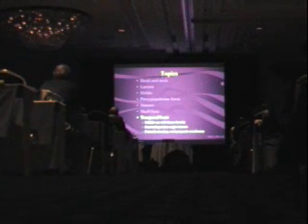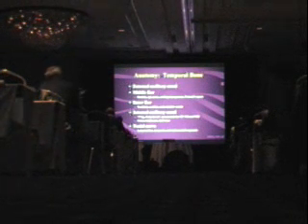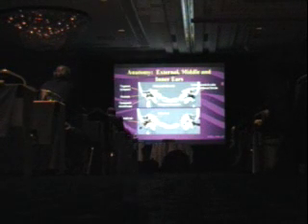All right, we're on like our last 2 minutes. Temporal bone. Okay, again, you could go through anatomy on your own: external auditory canal, middle ear, inner ear, internal auditory canal. All these things are handed out, they're all labeled. Certainly you gotta know the real buzzwords like the scutum.